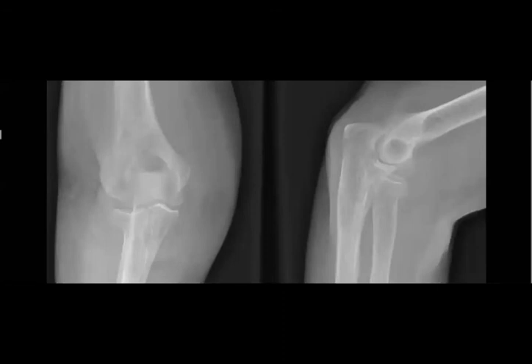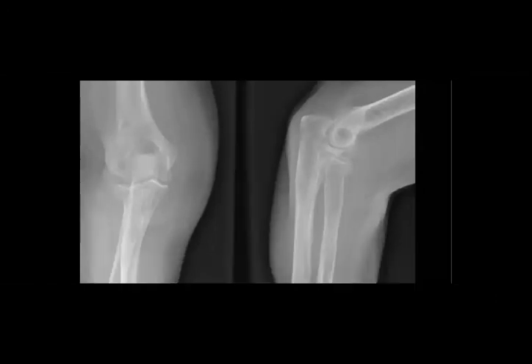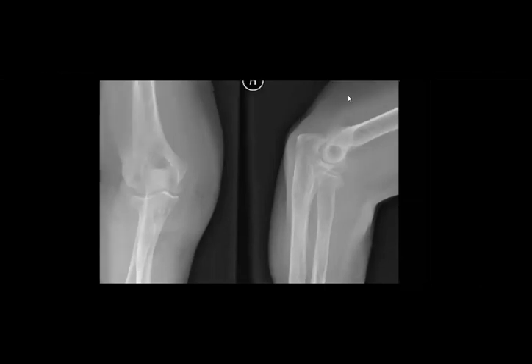Okay, Marwa. So what do you think about this elbow of the patient? We mentioned already, you will search for supracondylar. So if it is not supracondylar, what will it be? The second common. Nermeen, revise again. Ala, yeah. 5 flowers for you. So it will be radial head fracture. Radial neck fracture. Yeah, radial neck fracture, radial head neck fracture. Okay.